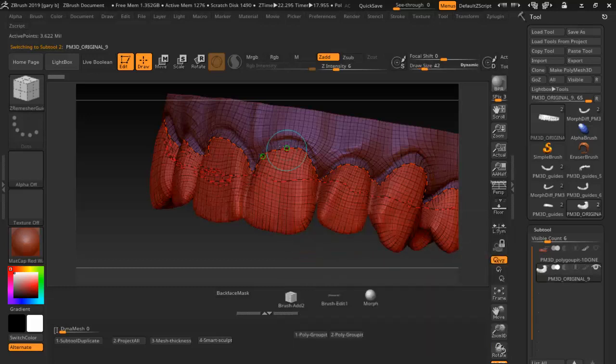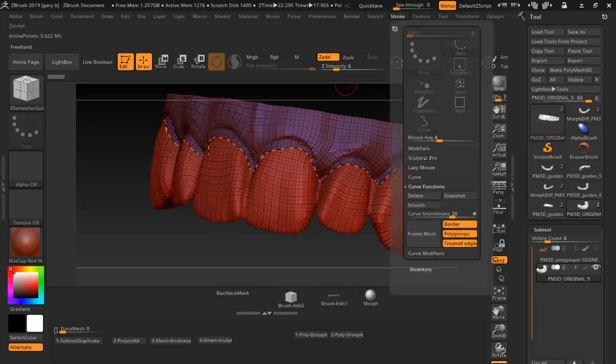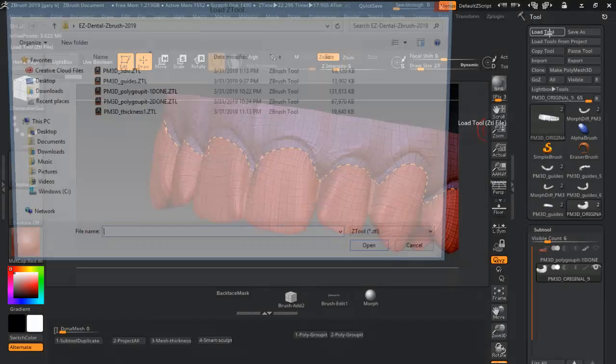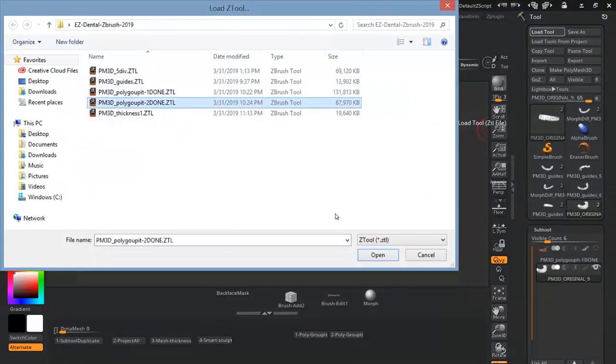As you can see here, some of the lines look a little jagged. Sorry, I had to pause there. And then you can go ahead and smooth some of this out a little bit if you want to. Whatever it takes. Then when it's done, like I said, it's very intense. I don't even want to use it. All right, then I'll use the one that's done here.